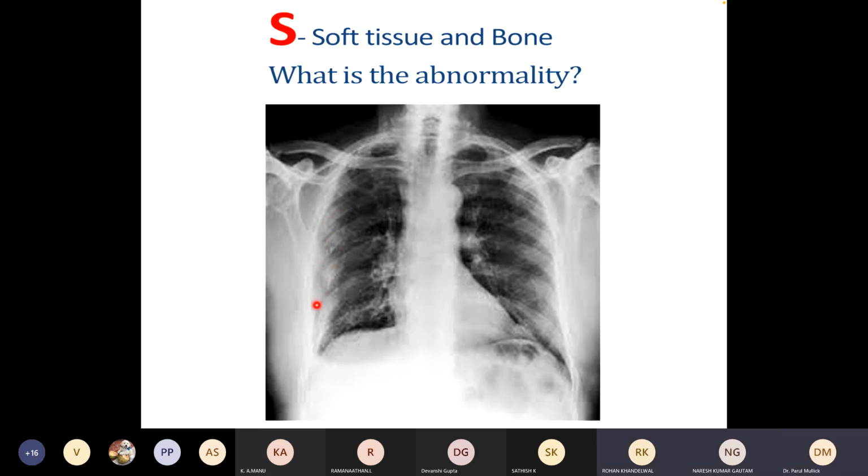Yes, ma'am. Subpleural calcification. बेटा ये कैल्सिफिकेशन नहीं है, ये multiple rib fractures हैं. ये white नहीं बेटे, ये देख, these are multiple rib fractures. ये continuity टूटी हुई है ना. Yes, ma'am, break in continuity. So these are multiple rib fractures.